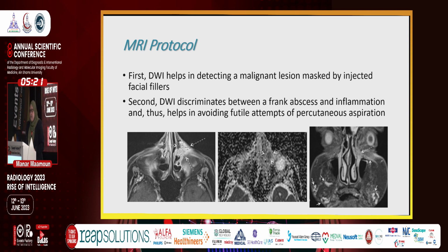So in this case, there is a mass-like lesion that was initially mistaken for filler because the patient has frequent previously injected fillers, yet there was diffusion restriction with mass-like enhancement, and it was proven to be a lacrimal sac squamous cell carcinoma.